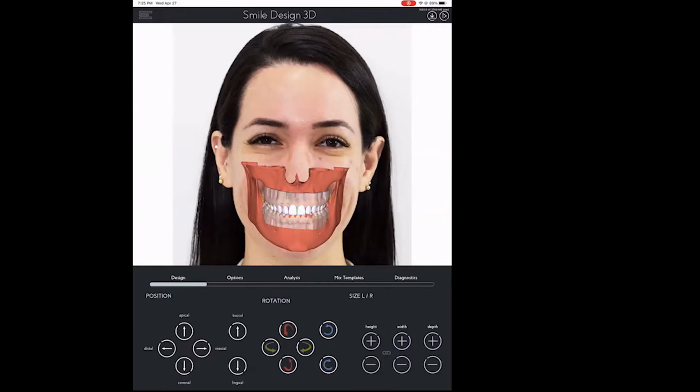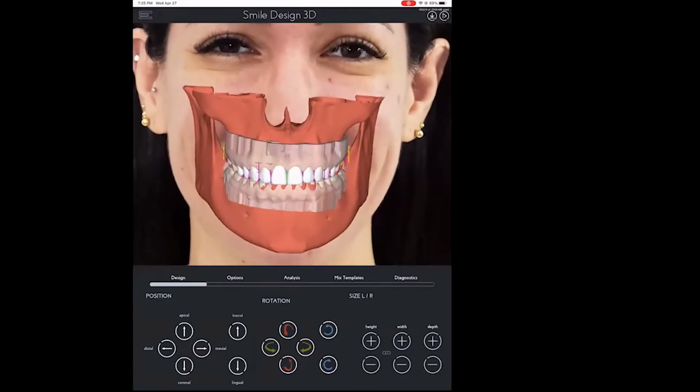All right, so I'm going to show you how you can do it, and it's quite simple. Here, the files are already calibrated due to time, but like I showed you before, you set 3 points and they will merge together.